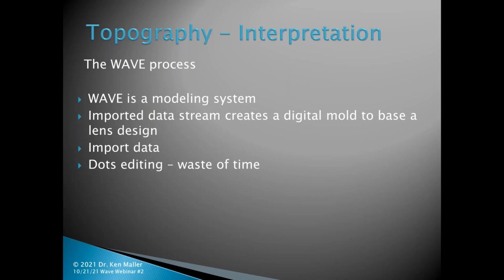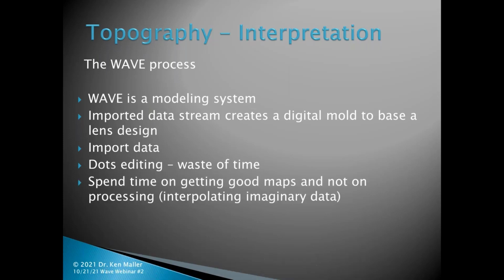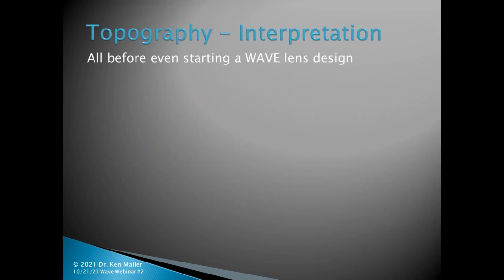Dots editing, don't waste your time with that. Spend time on getting the good maps and not on processing and interpolating imaginary data and adding in dots and things like that. That really is a waste of time. So all before even starting a WAVE lens design, I've created this list.